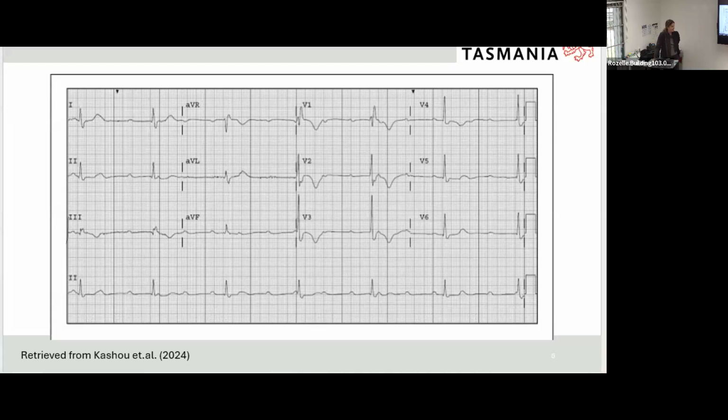What do you describe first? Good question. We normally describe our underlying pattern first, and then we would describe those additional layers as well. So we'd say this is a 3rd degree heart block, or dissociated AV block, with potentially a right bundle branch block as well.